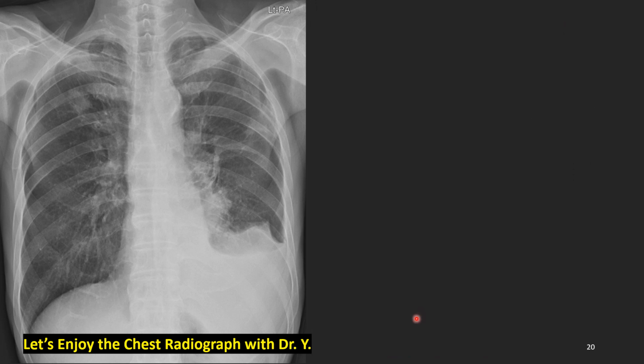What about this chest radiograph? What do we see? Look at the left hilum, infrahilar portion, bulging mass with irregular margin, increased opacity, obliteration of a heart border, paraspinal line border, with a large pleural effusion, nodules here on left side, another 1.5 centimeter nodule in right upper lobe. Yes, an aortic knob is not good looking. Large mass here with metastasis to the lungs and malignant pleural effusion. I think so.